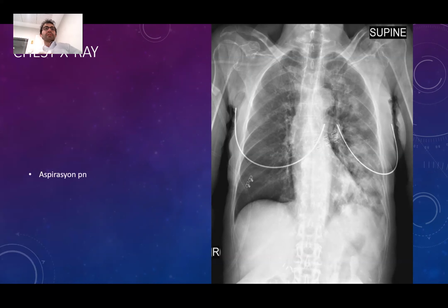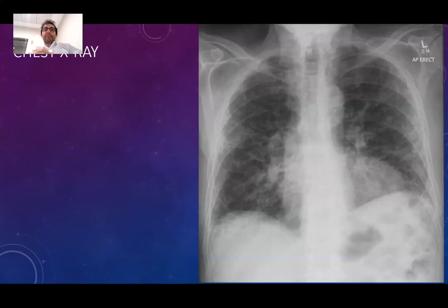This case was an aspiration pneumonia. Aspiration pneumonias are actually atypical pneumonias, mostly, because they are anaerobes and they have patchy appearances. The heart is fine. The aorta is a little bit prominent, but it is not aneurysmatic. It is not dilated. That's pretty much it. Thank you, doctor. Yeah, let's look at this one.